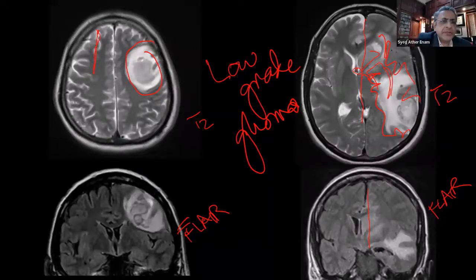Okay, so this is probably the precentral sulcus. It is difficult to say in this section, but it seems that this is the central sulcus over here, because this thing is thicker. I don't see an omega sign. Here this looks like a little omega, but then this is too thin for that. So it's possible that maybe this is the central sulcus and this is the precentral sulcus. That is possible.